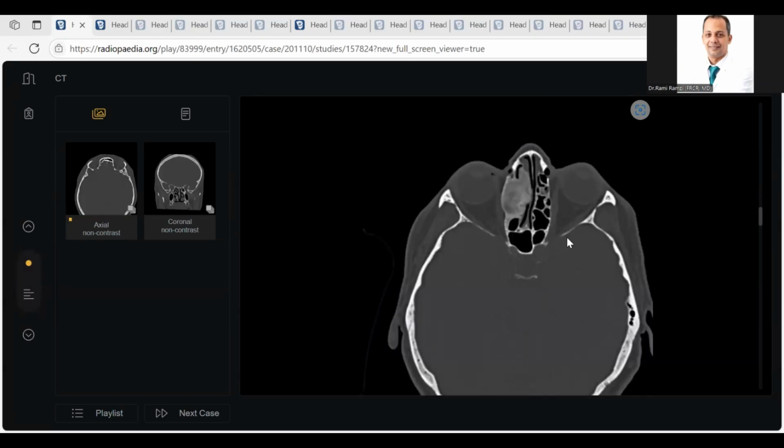I think you wanted to say that this is an osseous matrix. Let's revise. When we are dealing with a chondroid matrix, there are arches and rings of calcification. When we are dealing with osseous matrix, there is ground glass.